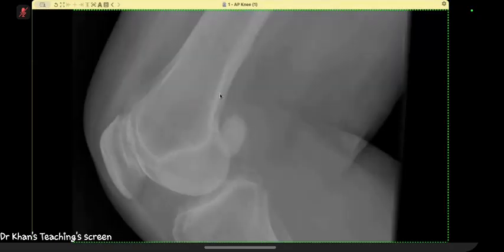Now, this is calcification, and you have to develop your eyes to look at calcification and rule out any trabeculation, because a mature myositis ossificans will have trabeculation. Now, those are not in this particular case.